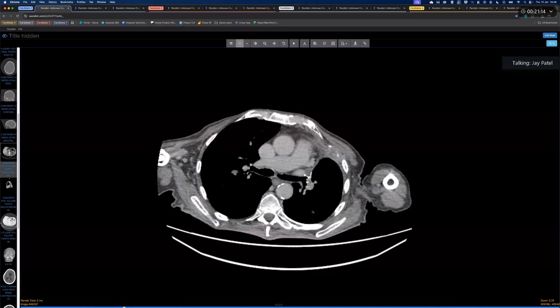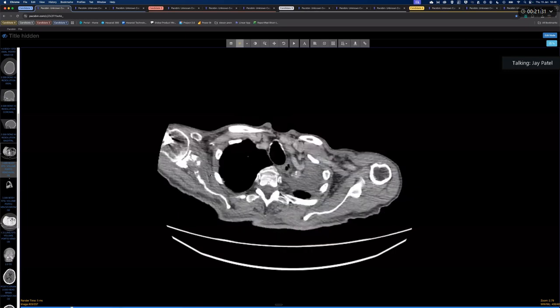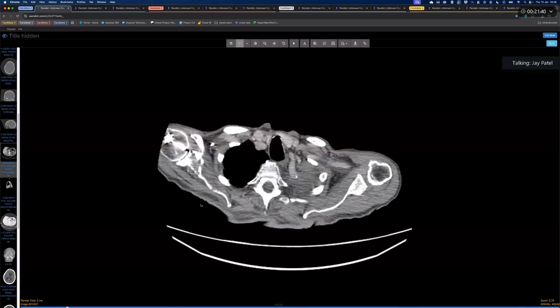And if the examiner at that point wants you to concentrate on something else, they'll direct you typically. They don't really want you talking about the thing that's not relevant, so they tend to move you on if it's not. One of the things, again, that I'd say you did exceptionally well, I think that's quite a hard spot, that scapula, when you're looking on soft tissue windows. So very well done on spotting that.